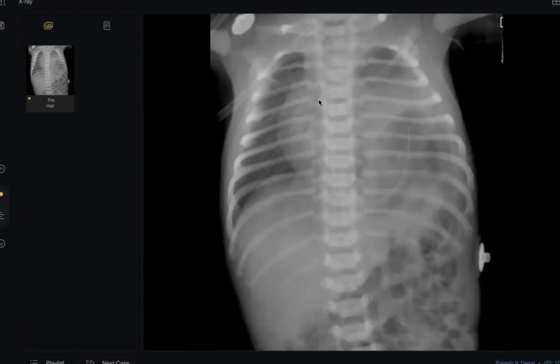Respiratory distress at birth. Go on. Okay, sir. I'm presented with the X-ray chest and upper abdomen of a skeletally immature patient, and in this X-ray, the obvious abnormality I can appreciate is inhomogeneous opacification involving the left hemithorax with mild contralateral mediastinal shift. The right lung field is grossly unremarkable, and I want to know the history of the patient.